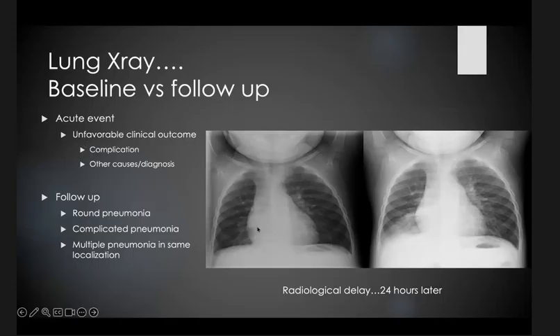Here you have a child that comes to the ER, first radiograph, not that much, but 24 hours later, you see that radiological delay in the pneumonia that was probably starting there. The baby came back really worse, so they did it again.